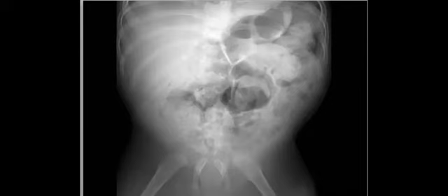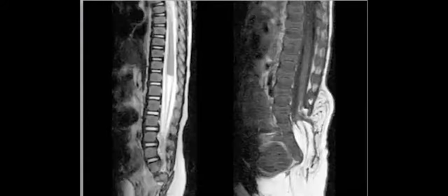So in this frontal radiograph, the vertebral body is okay, but after that you cannot find the sacrum, and also the iliac bones are deformed. So this is like a deformed pelvis, no sacrum. Nice, okay. I'll try to come back to this case. It will be caudal regression, yes. If I show the MRI, how do we describe it?